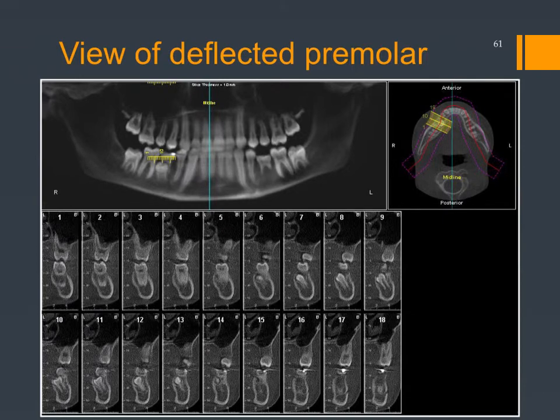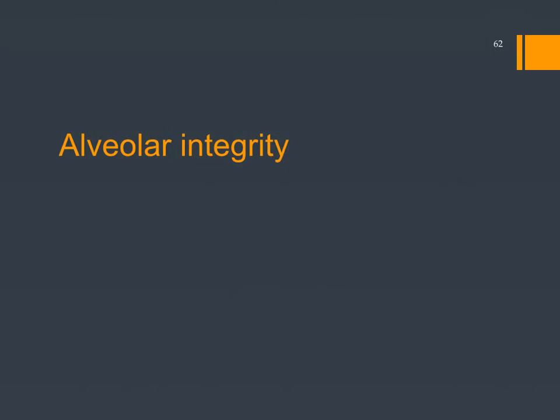And I think we've got to get that baby tooth out, because look how the premolar is going off towards the buccal. And we really need to correct the eruption vector of that tooth. So the x-ray was very useful to make those decisions. Alveolar integrity is something that is concerning us at UCSF. I'm convinced that the cortical plate in the front is pretty easily damaged.